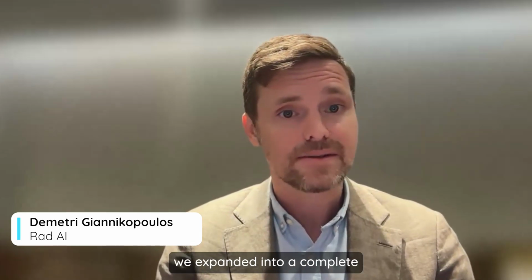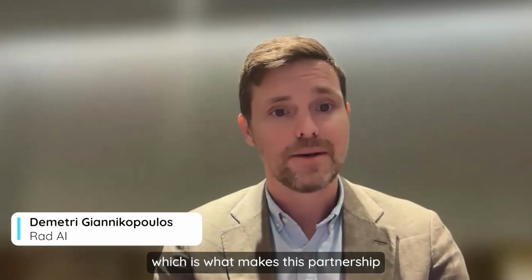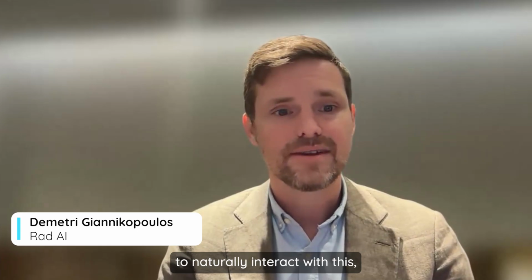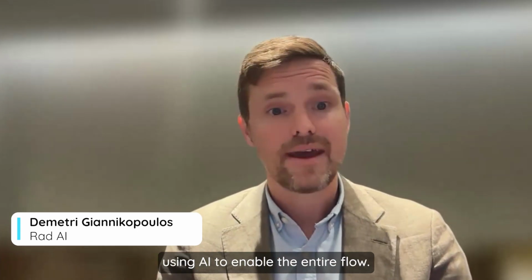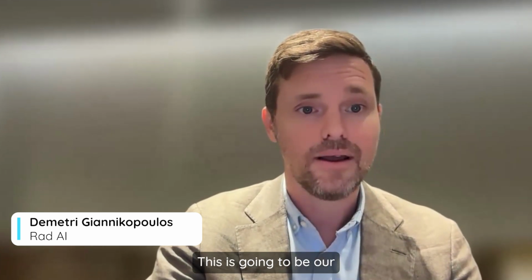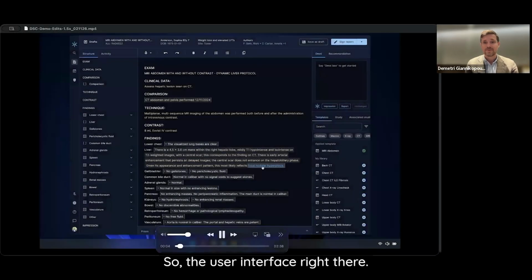Based on request, we expanded into a complete reporting solution, which is what makes this partnership particularly dynamic, because that complete reporting solution provides the ability for the radiologist to naturally interact with this type of information, using AI to enable the entire flow. So with that, I'll actually give a view of what it looks like. This is going to be our reporting interface that you're going to see in a second here. So the user interface right there.